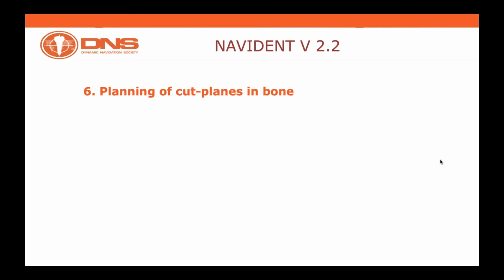The question is, we do have the chance to do matching. In this case, we do have corticectomies, and therefore we do have a planned corticectomy. And we do have another area, which is a black area, which is the end result of a corticectomy.